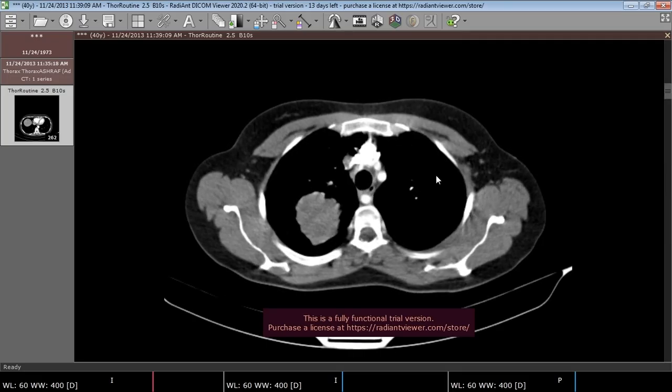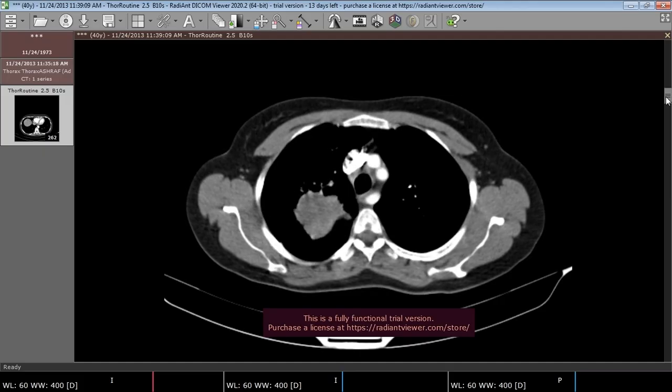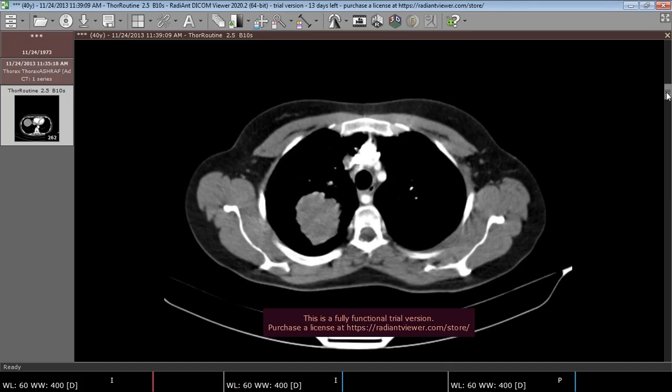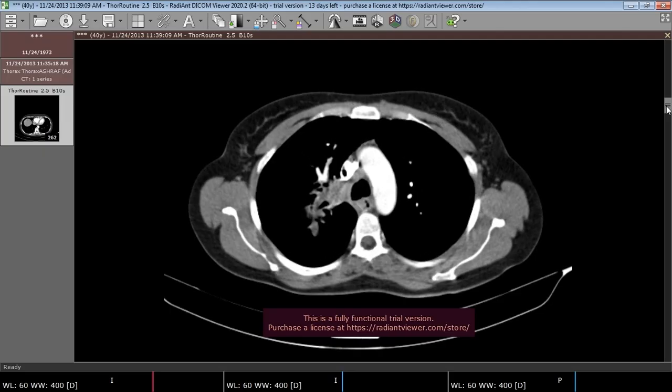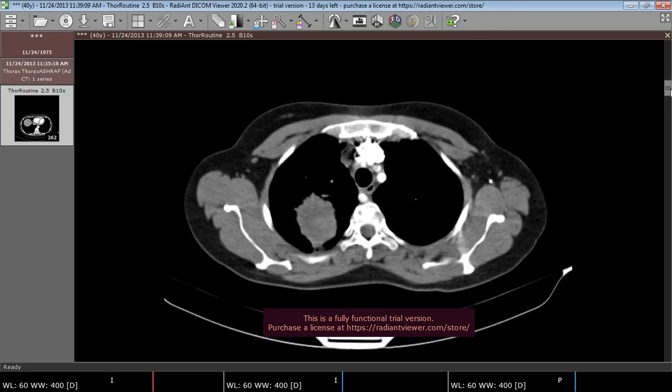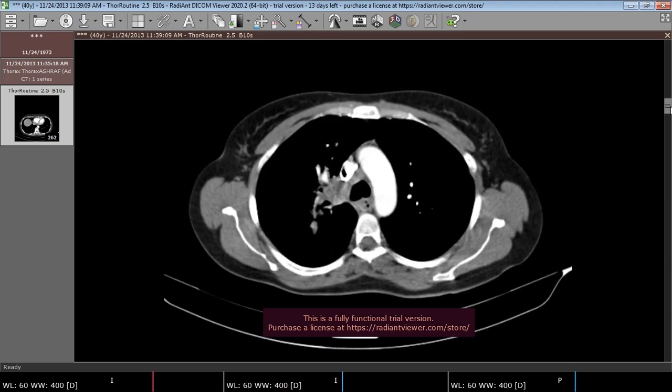The pathology is very obvious. It's here, this mass lesion. What's striking about this mass lesion is that it is a totally solid lesion without internal air bronchogram. This is very notorious for lung masses, for neoplastic lung masses or bronchial carcinomas.